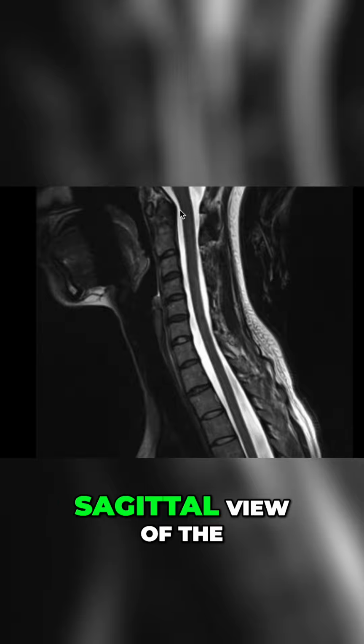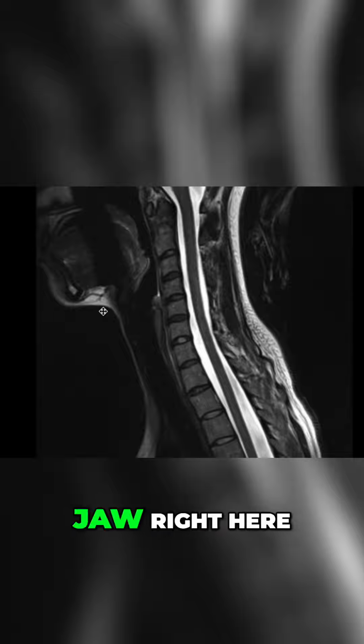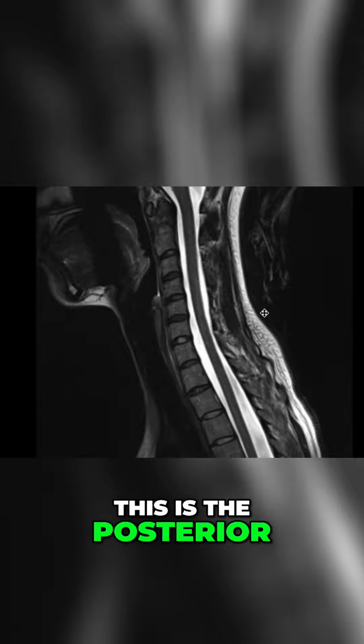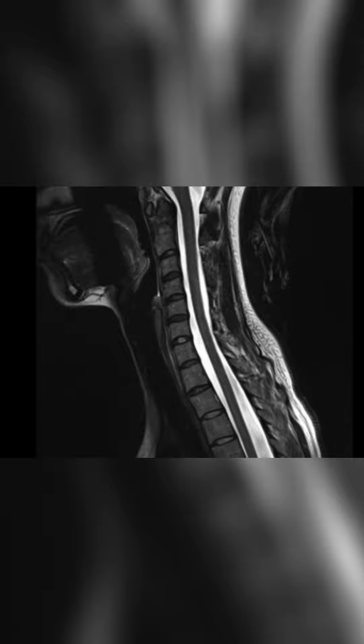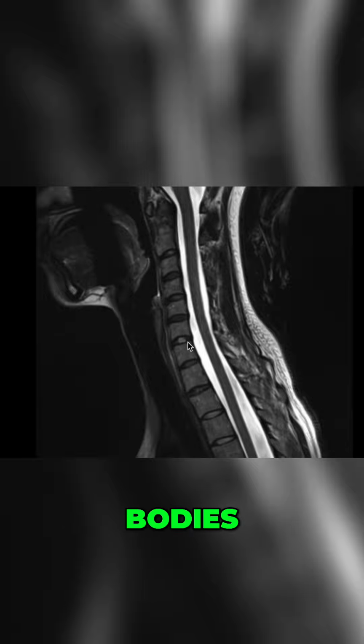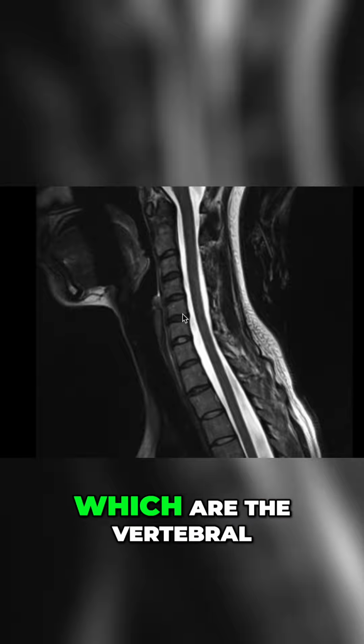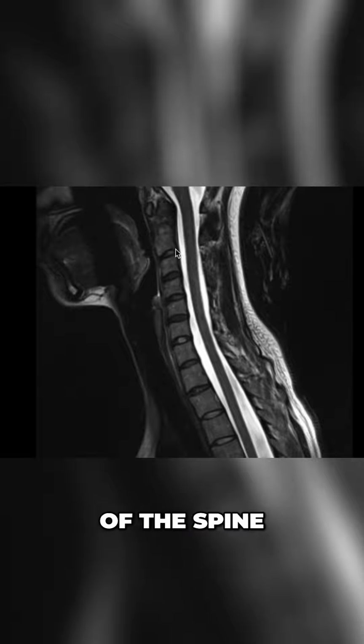So this here is a sagittal view of the spine, where this is the front, this is the back, kind of like a profile view. You can see the jaw right here. Again, this is the posterior aspect of the cervical spine. These here are the vertebral bodies, and between them are these discs, which are the vertebral discs or the cushions of the spine.